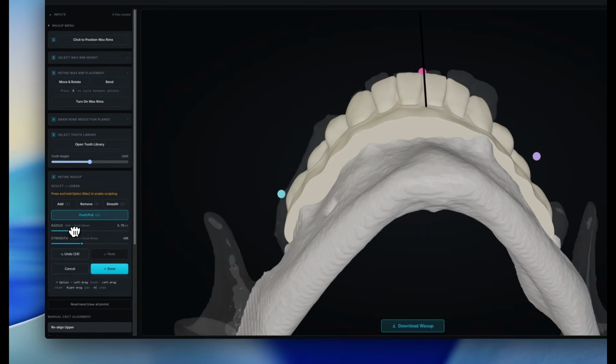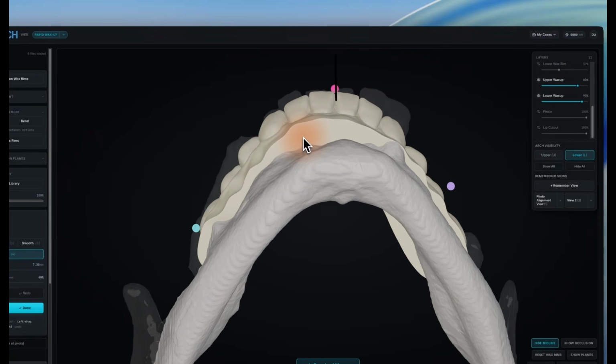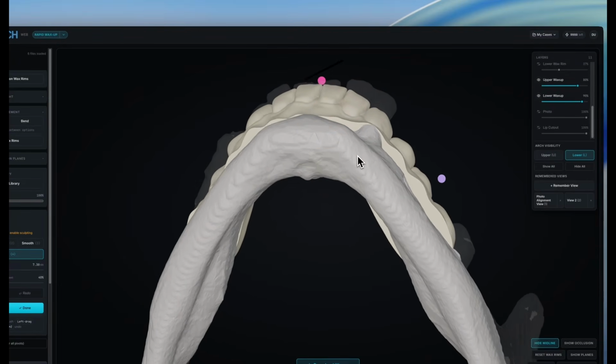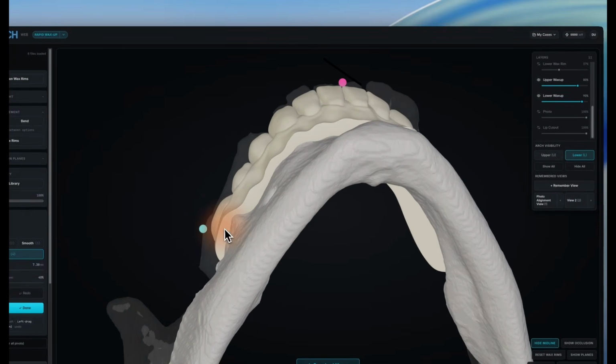We've all run into situations where we do our alveoloplasty, we do our conversion, deliver the teeth, and we have these huge ledges hanging off of the patient's buccal. And this is because our designers could not really predict where our alveoloplasty was going to be, and then our wax ups ended up with these rims or shelves hanging off of the buccal or the lingual.